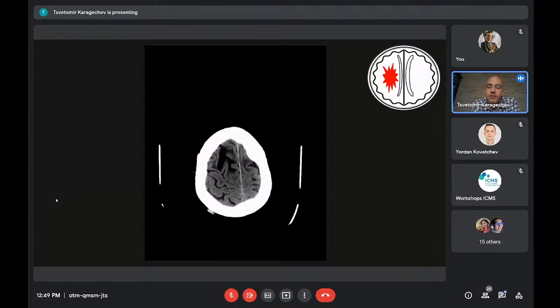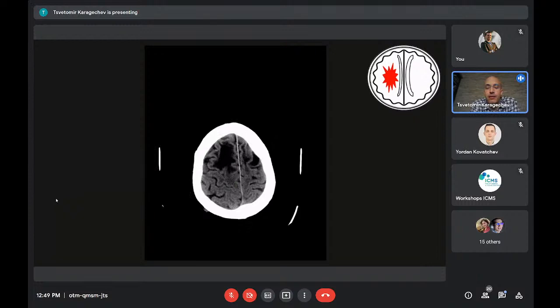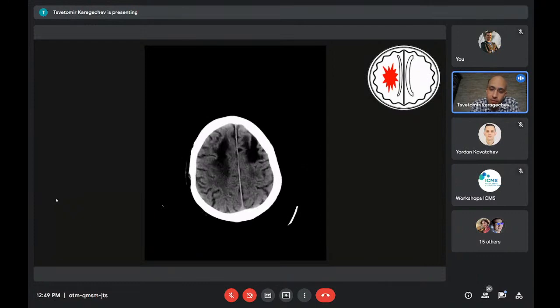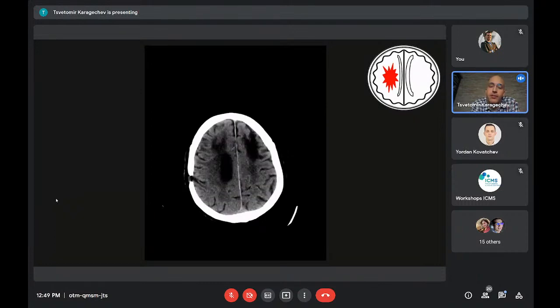So we will start from the bottom slices. And I know that you're already distracted. You're already noticing these hypodensities in the frontal lobes. That's really dark. And for now, you can really forget about them in this case. These are all ischemic changes.